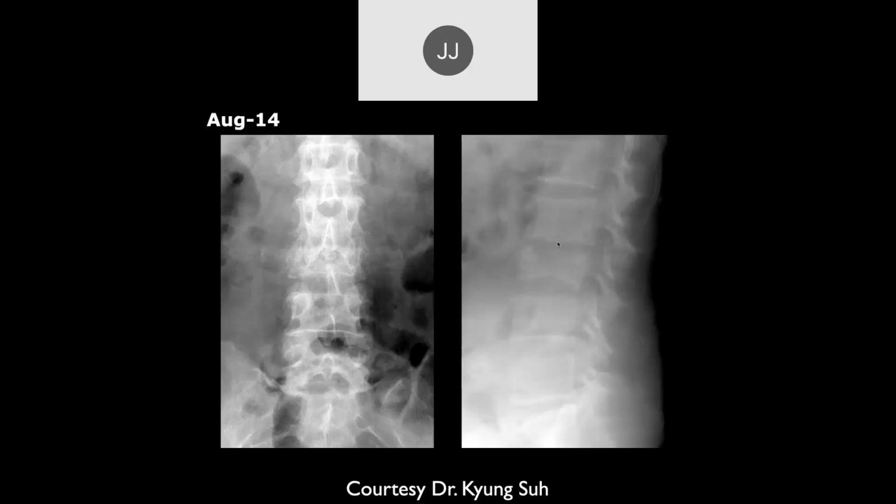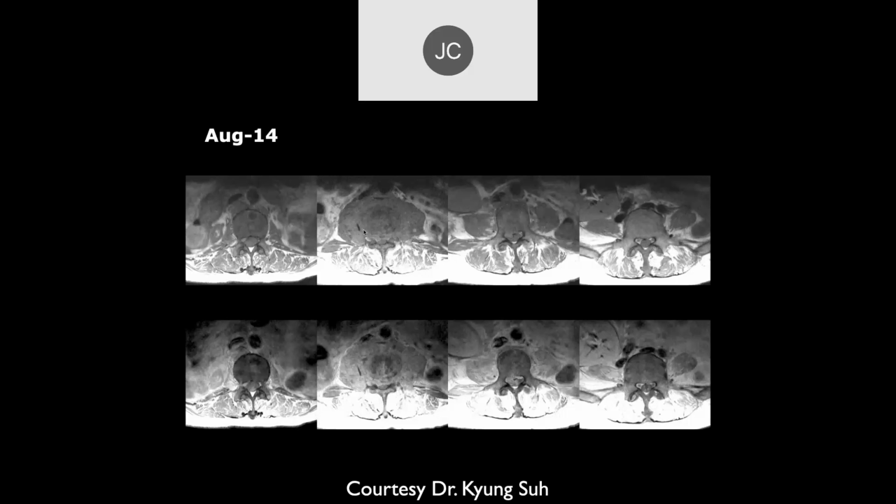But whether it's infected, you have to have an MRI. And I think the adjacent end plates aren't entirely normal. That's what a normal end plate should look like, and we're really losing the end plates there. So the MR scan, here's your MR that John wanted. There's loss of the normal signal on that top row, and an end plate deformity at L3. So we're at 2 discs, 3 vertebral bodies. And here are the axial images, a lot of surrounding soft tissue.